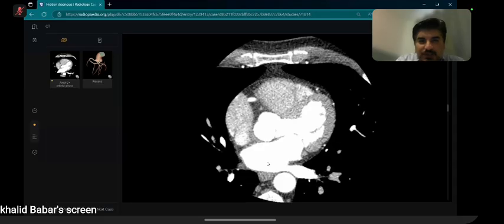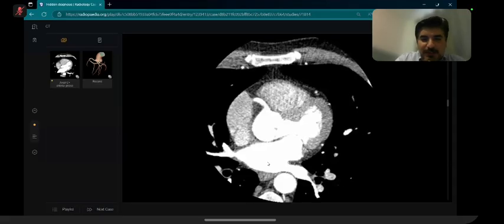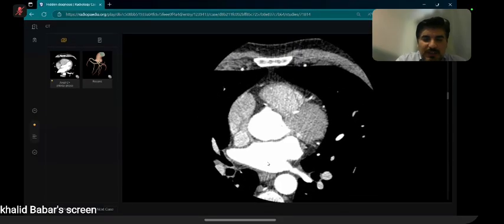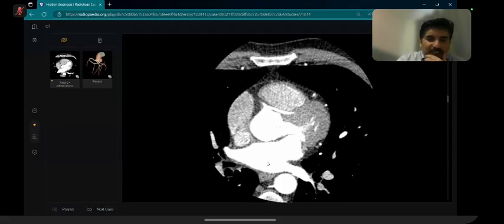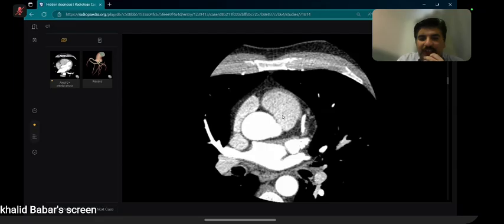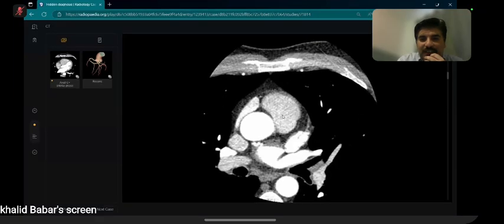You've done really well. You have corrected your mistake. This is really important. So again, it is a similar course, different patient, similar pathology. Here there is just a slight difference. This is not the pulmonary trunk. You can see the pulmonary trunk is up here superiorly. This is the right.